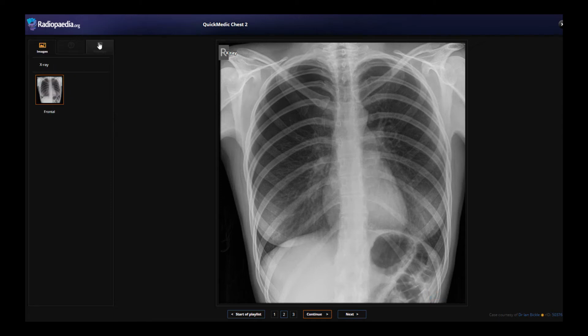So this is a pneumothorax, as it says in the report, and the treatment for which is inserting a chest drain. It is common in young slim men, so this is a lady. You have to query underlying pathology, and this would probably warrant a follow-up CT scan and discussing with the respiratory team, of course, but the definitive management for this is putting in a chest drain, watching it resolve, and trying to clarify what has caused this pneumothorax.